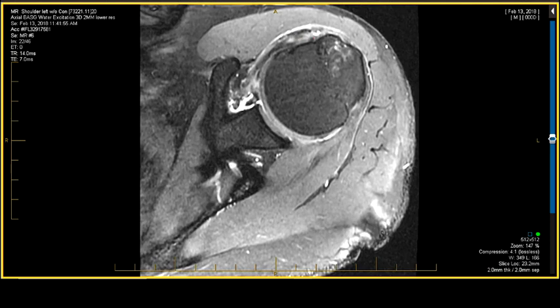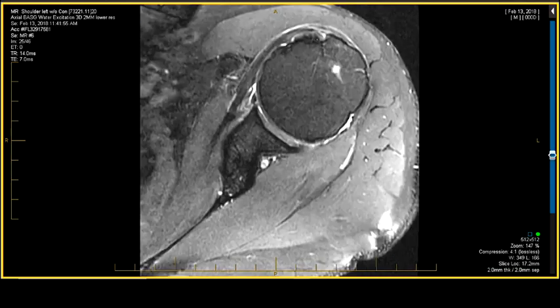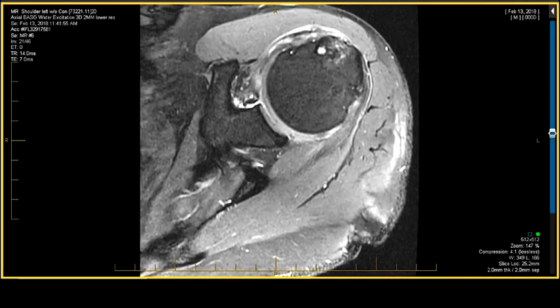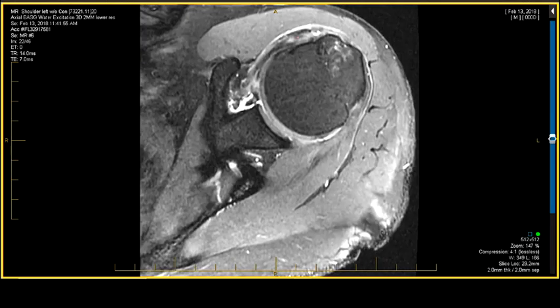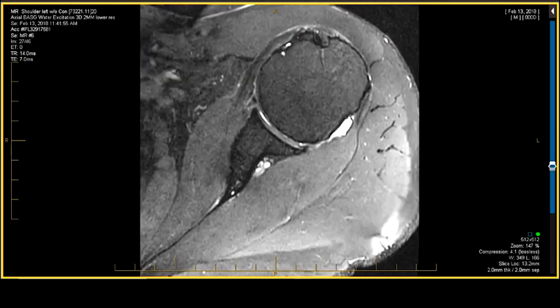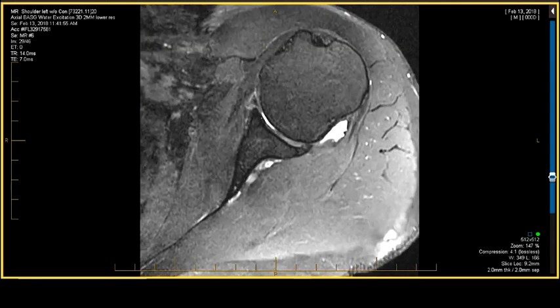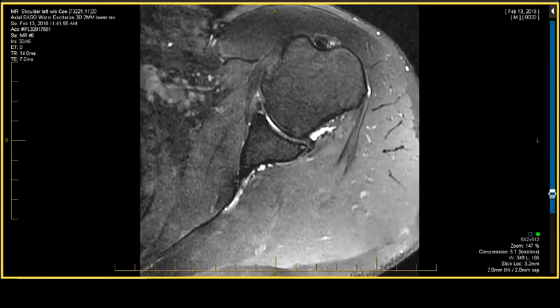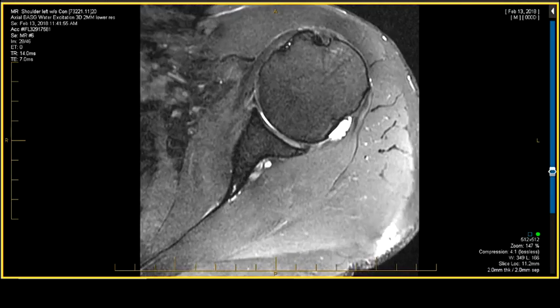It's falling into the arms of the subscapularis. Right? There's the biceps. There it is, falling into the arms, interstitially in the subscapularis. There it is. So there is a medial biceps pulley mechanism. There's delamination of the subscapularis. There's arthropathy, right? There's chondromalacia. There's posterior degenerative changes and chronic fissuring of the posterior labrum more than the anterior labrum.